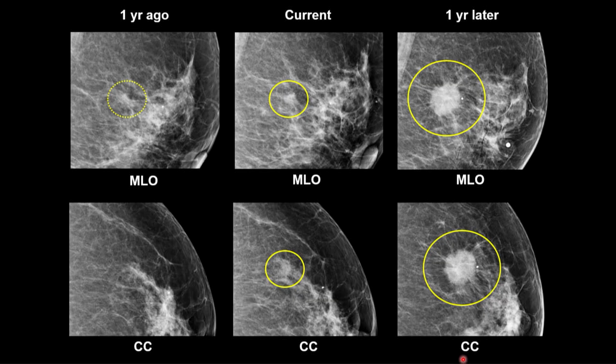Well, we could have gotten it on current, because I did notice on current, because we know that this is a case where every one of these has cancer. We're like, where's the cancer? Well, I don't mean for you to look at these knowing they all have cancer. Case 18 didn't have cancer. It was a keloid. Some of them were superimposed tissue. They don't all have cancer. Yeah. No, but this is a case where we missed it. And you're going to have cases where you miss it too.